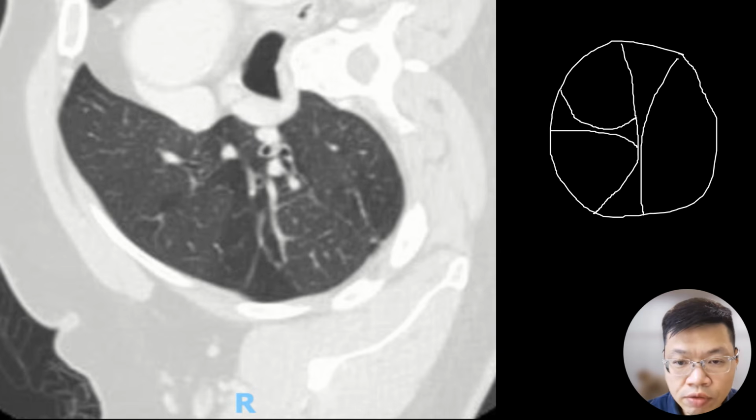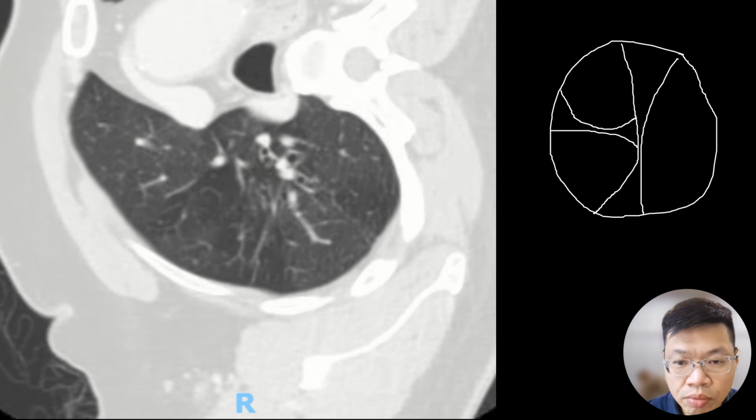And as we scroll forward, we will see that it splits into two at this point over here, up and down, and we should draw the angles as such, with the same branching angle as seen over here. So if we were to draw that, it will appear like this.